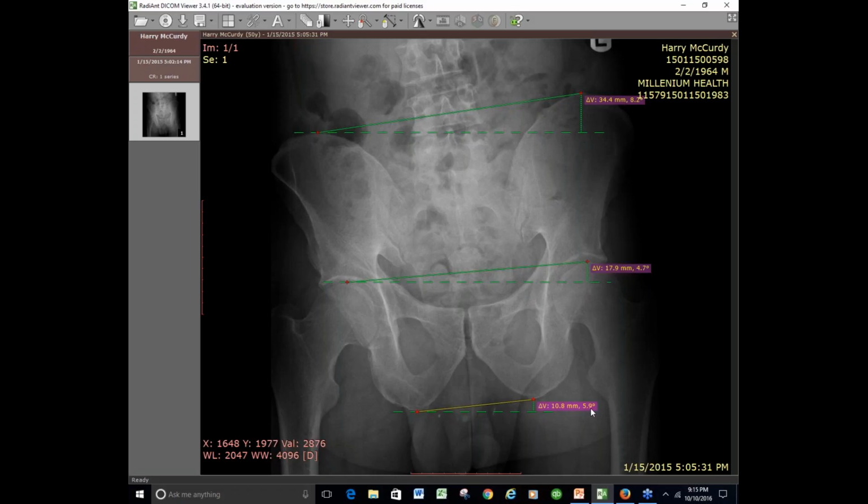And so basically what's going to happen when this person sits down, they're going to lose 5.9 degrees of angle on their pelvis. And if we take that 5.9 and basically drop that 5.9, it's going to be significantly different. And what we're really trying to do in our closest approximation for this is because we want to get the spine straight when the guy sits, right? That's really the whole point. And you can see how deviated his spine is. And a lot of that has to do with this is a standing x-ray and he's got an 18 millimeter leg length inequality.